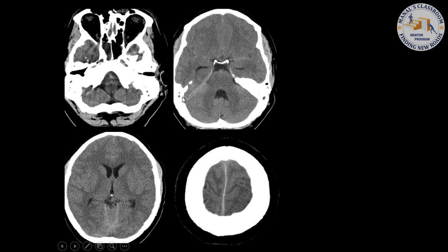And I show this case because this was a case I came upon when I was at University of Michigan, and it still scares me, in the sense that this was a case that was seen in the middle of the night. It was a child, and it was read out as normal. And I think in general it probably could be normal, but in children you should not have dilatation of the temporal horns like this. They were a little dilated, and again, I looked at it the next day. I wasn't quite sure, but they called it normal, and unfortunately 6 hours later the child died.